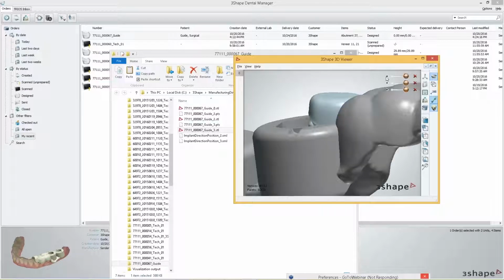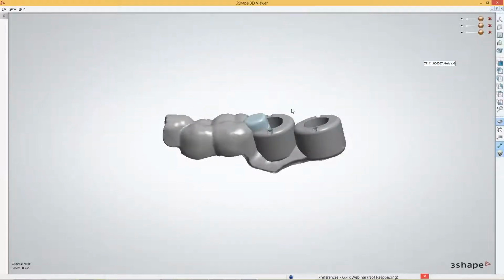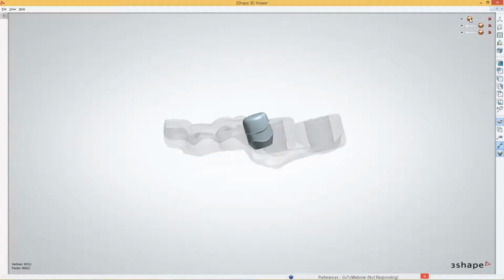By showing you this, I wanted to also, let's say, relate to what you might have seen on the videos or on our materials available in social media, that we can deliver or prepare the planning with a complete package of the components, as much as the drill guide being prepared and manufactured locally.